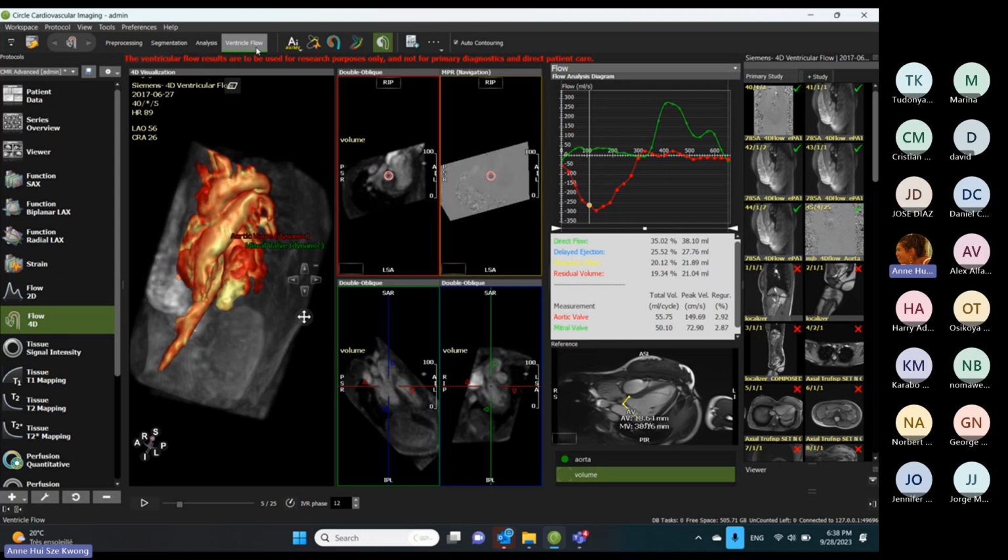Yeah. So the brain, I have seen. So you need to understand that the software isn't for the heart. So we have the approval for the heart, but I have seen a lot of hospitals using the 4D flow for the brain, and the quality of images is good enough, and you can analyze them. But let's say the AI couldn't work, of course. But they have a lot of sites.